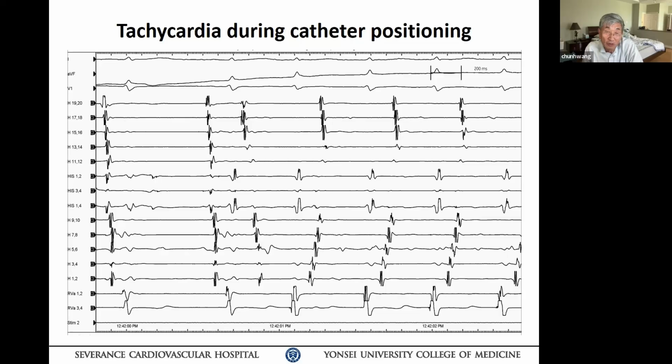So you already say, wow, this cannot be only one tachycardia. You already have a conclusion here. You should notice that right up front, because you simply cannot have a septal A activation variation in a single loop reentrant tachycardia, because it has to be consistent. Go to the next slide. Keep going.